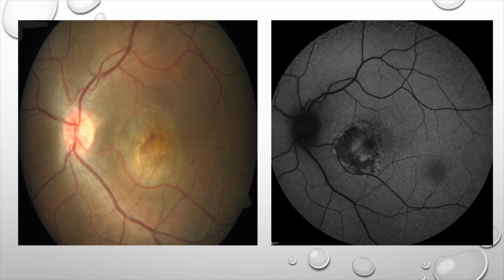So how many of you feel that what you see on the macula is a flat lesion? How many of you feel that it is a raised lesion? If you're going to tell me it's a flat lesion, you will tell me the reason why. If it is a raised lesion, you will tell also why. How many are for flat? Give the reason why you say flat. Sir, I thought it is a two-dimensional fundus photograph, so it is difficult to comment whether it may be a flat or elevated lesion. Excellent. Give to the next person and let her tell why it is elevated.